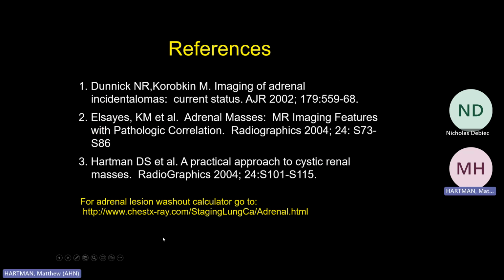So adrenal lesions. Remember, fat is our friend. Remember mets and lymphoma for each case. And remember to ask yourself, does the patient have a known malignancy? And does the patient have any signs or symptoms of adrenal hyperfunction?